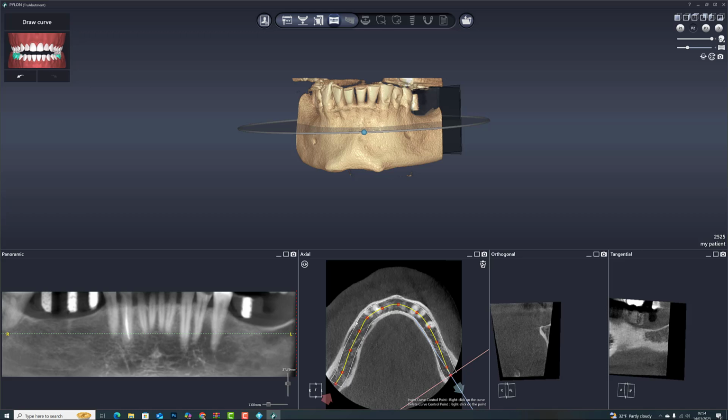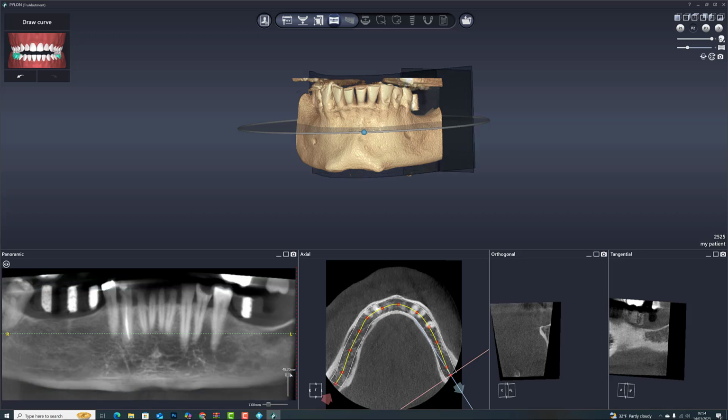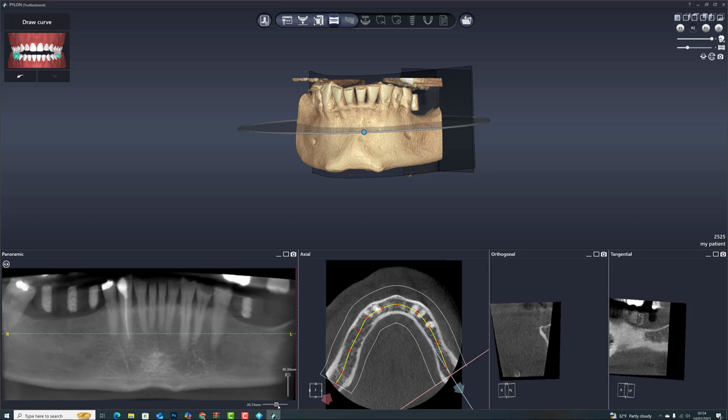Now, as you can see, the field of view here is narrow, both horizontally and vertically. Here, these two sliders, you can actually increase the field of view vertically, and here you can increase the field of view horizontally. Okay. All right. So then the next step.